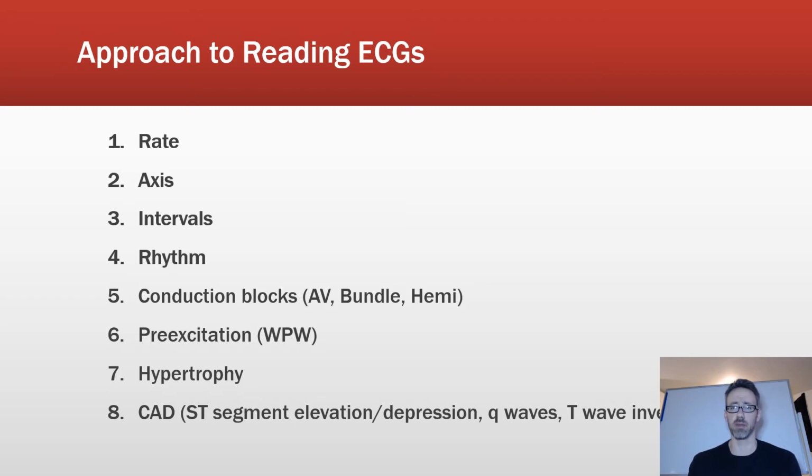Then the QRS complex: the duration of the QRS should be less than 0.1 seconds. You could assess its duration to see if you may have an ectopic ventricular rhythm, so it has become prolonged. There's an increased duration. Bundle branch blocks can cause an increase in the QRS duration. There might be multiple reasons, but if you see it's longer than normal, then at least it can lead you in that direction. And then, of course, the QT interval as well.